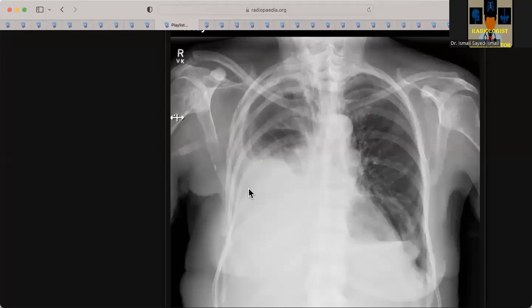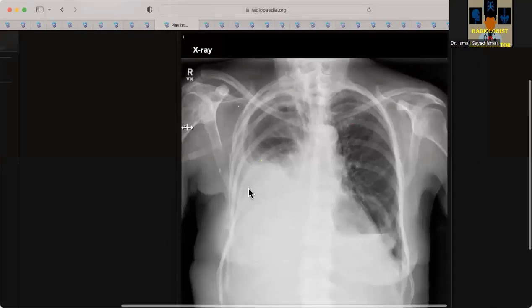Okay, so just sit back and have a look. Just look at the whole image, the whole X-ray. Just sitting back. Have you noticed that she's a female? Yes, this could be due to breast malignancy, because I can see that the right breast appears hyperdense than the left breast.